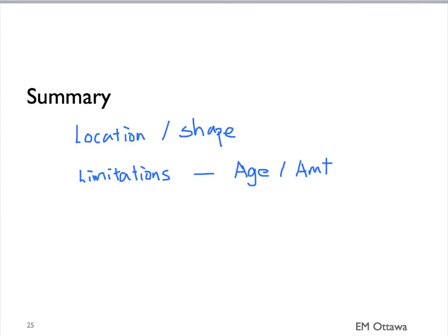In summary, we discussed the CT findings of patients with intracranial bleed. Based on the kind of bleed, the location and the shape will be different. We also talked about the limitations of CT scan based on the age of the bleeding and the amount of bleeding. We also discussed how we might want to do a lumbar puncture in a patient with subarachnoid bleed when the CT scan is negative.